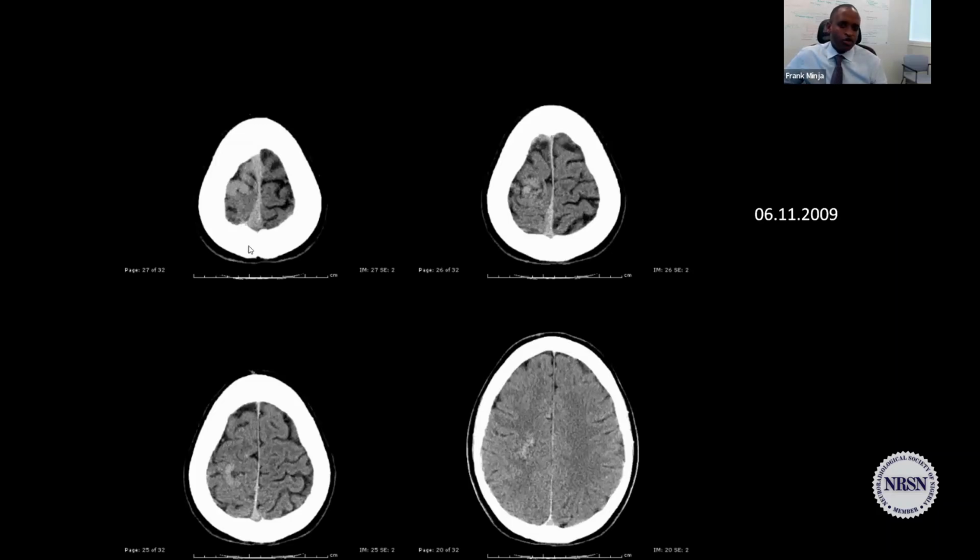Again, on a non-contrast, you want to be on your guard, right? So I love this case. If we're doing it in a test mode, we'll ask, why do you say this thing is hyperdense? Some people say, oh, maybe you have a hyperdense gyrus or something. No, you can't have a hyperdense gyrus that's sort of like painting one gyrus, right?